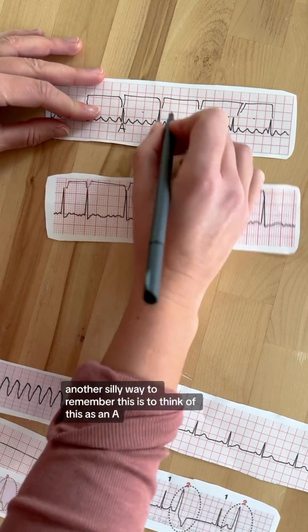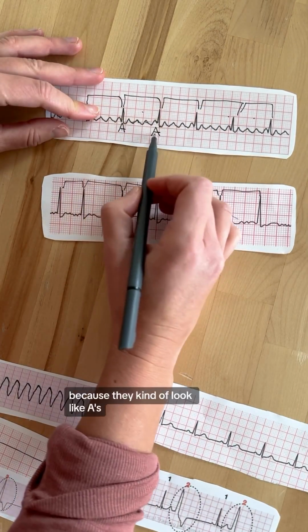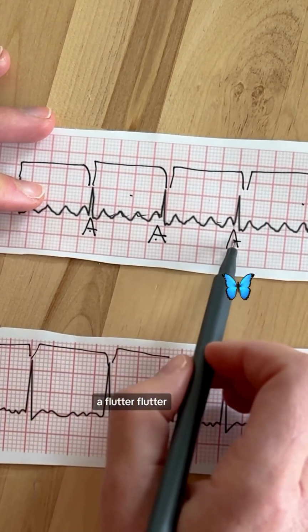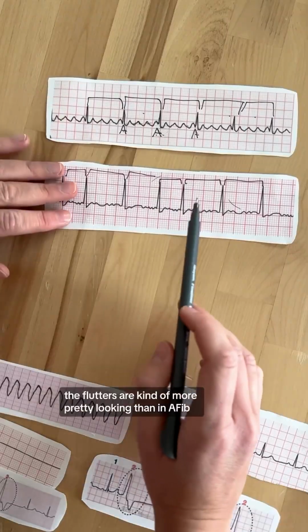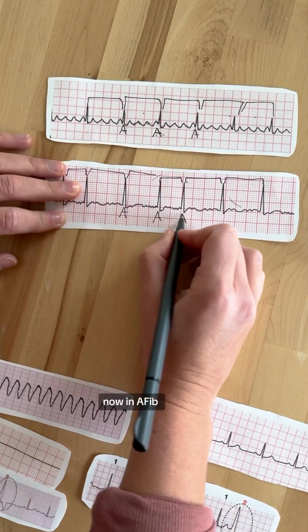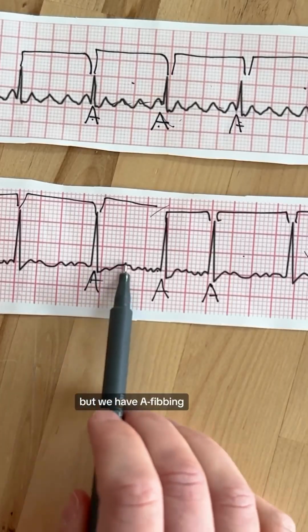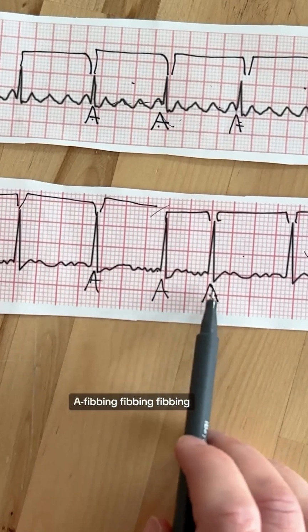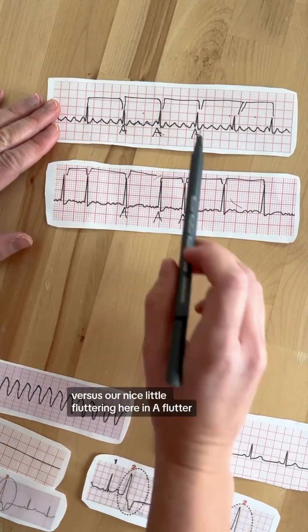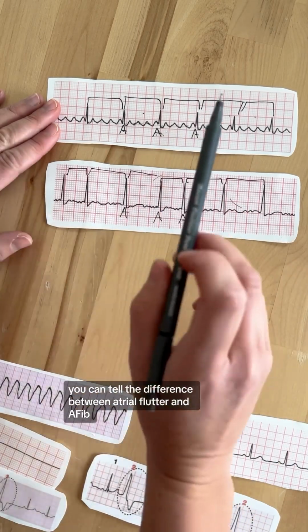Another silly way to remember this is to think of this as an A and this as an A because they kind of look like A's. And you can think A, flutter, flutter, flutter. The flutters are kind of more pretty looking than in AFib. Now, in AFib, these do look like A's as well, but we have A, fibbing, fibbing, fibbing. They kind of look more irregular versus our nice little fluttering here in atrial flutter. So now hopefully you can tell the difference between atrial flutter and AFib.